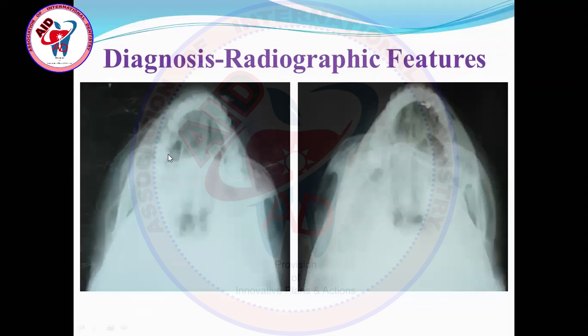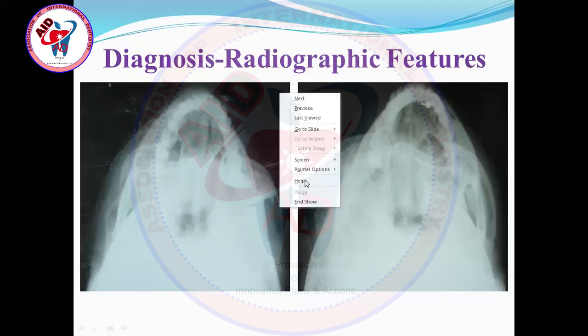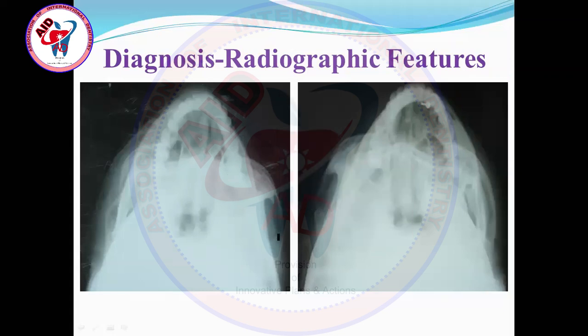Okay, one other recommended radiograph for zygomaticomaxillary complex fractures is the submental vertex. This is a submental vertex view, also called the jug handle view, because when you visualize this, this is a normal arch on the left side. I'm discussing this left-sided radiograph at the moment. This arch is a properly shaped normal arch.